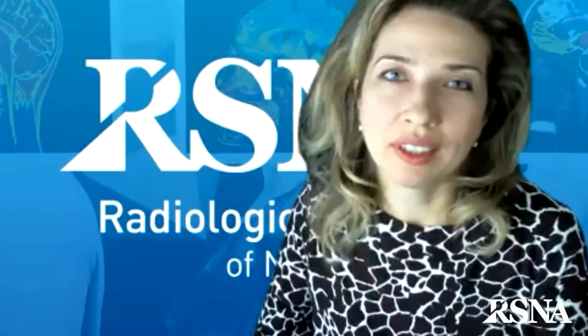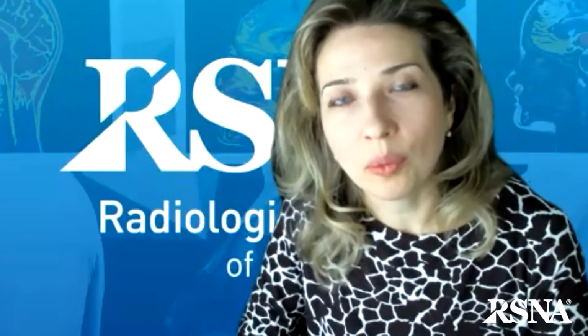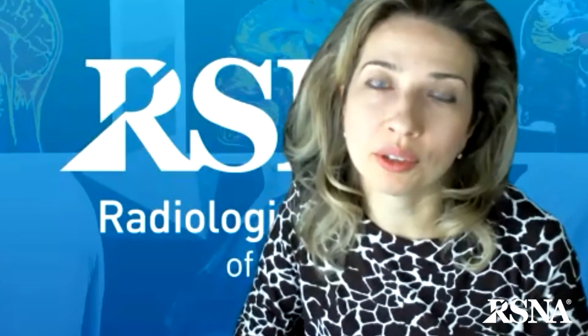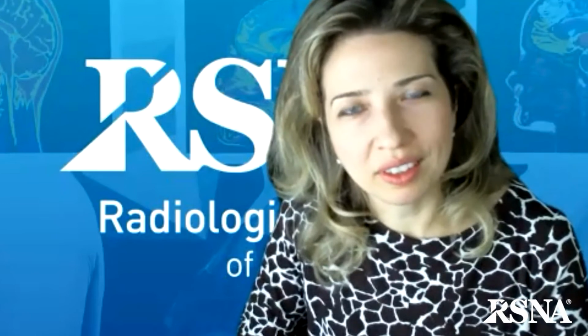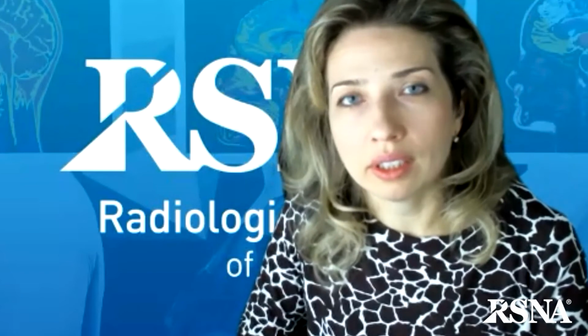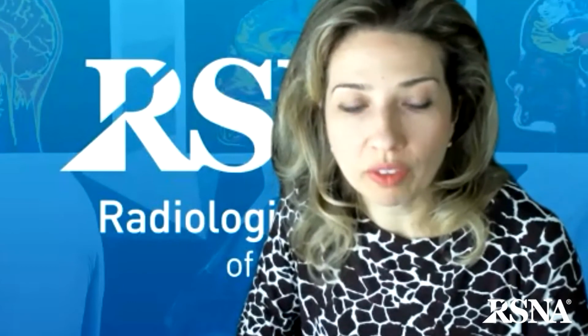interpretational pitfalls. And this is something to do with familiarizing yourself with the anatomy of the flexor and extensor apparatus. It's quite fun, and flexors in particular, it's that interplay between the flexor digitorum superficialis and profundus. It is the tendon synovial sheath anatomy, it's the pulley anatomy, and the flexor tendon zones, which I touched upon.